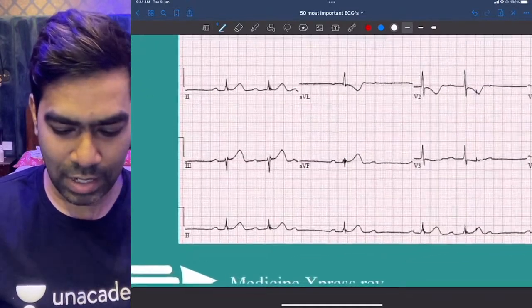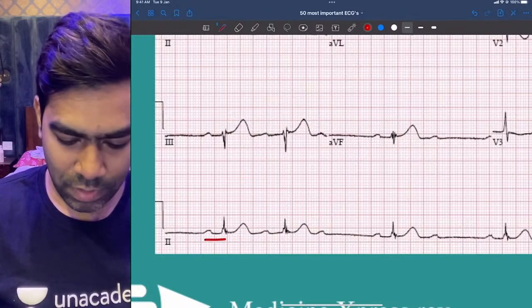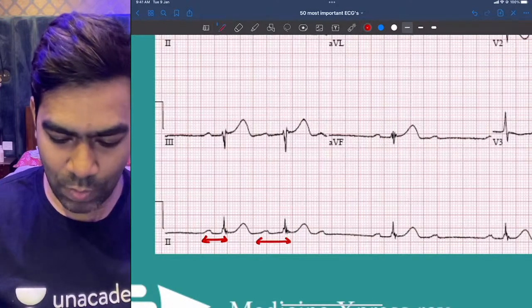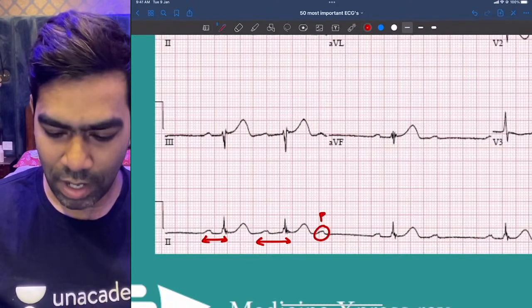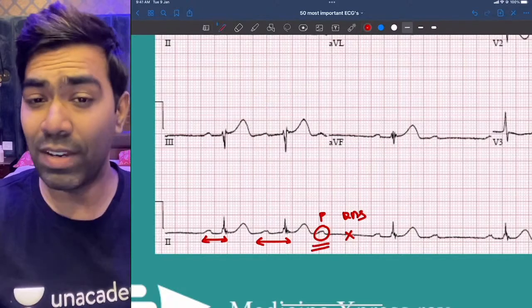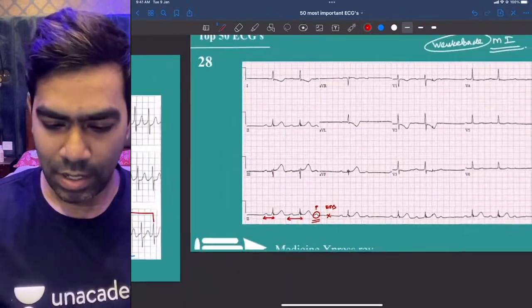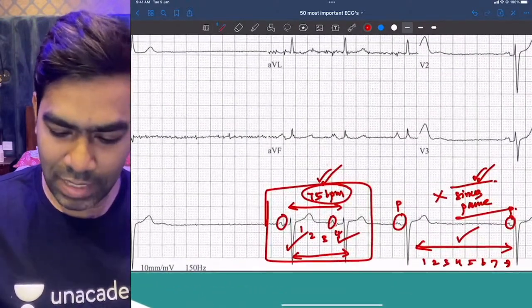So what you're seeing here is a patient who's having sequential prolongation of the PR interval, then followed by a P wave and you don't have the QRS. QRS is getting missed here. So if this kind of blocked P waves are there, then only you are going to diagnose a Mobitz. Please understand, in sick sinus syndrome, the P waves itself are not there.